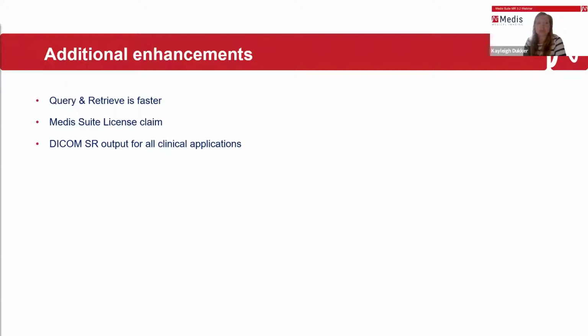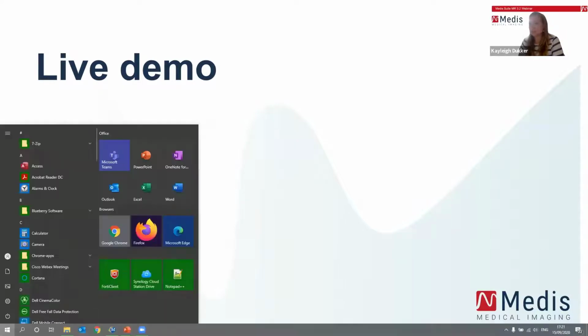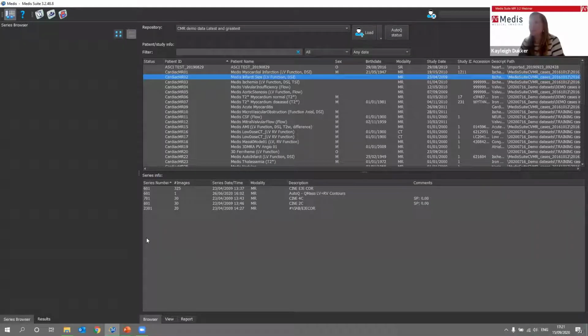I don't think there are any questions yet. If you have one, please do not fear to write them down. There is plenty of time for me to go over them. But then I would like to continue with a live demonstration to give you a bit of a feeling of how these different things look in real cases, and where to click, etc. So let's continue to the MediSuite part. Let's first go over the function analysis.